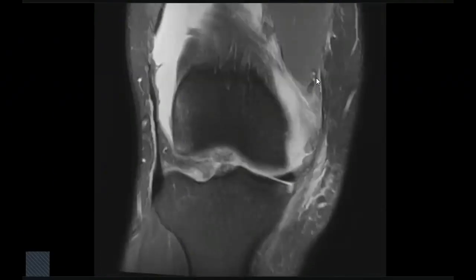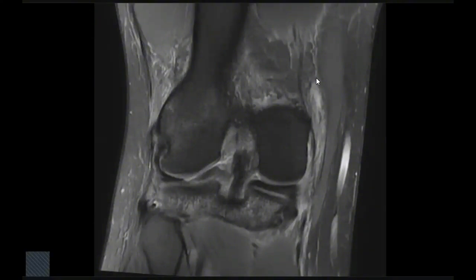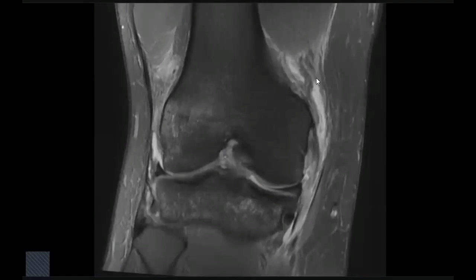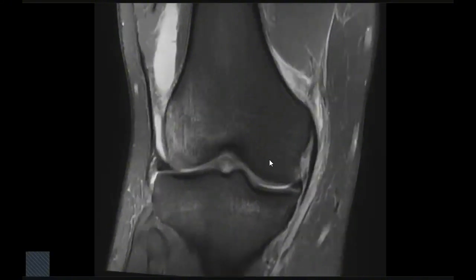So this is a coronal PD FATSAT series for the knee. I will scroll through the images. What are you assessing in coronal images? In coronal images, first I will assess the menisci and bone marrow edema. I also assess the medial and lateral collateral ligaments.